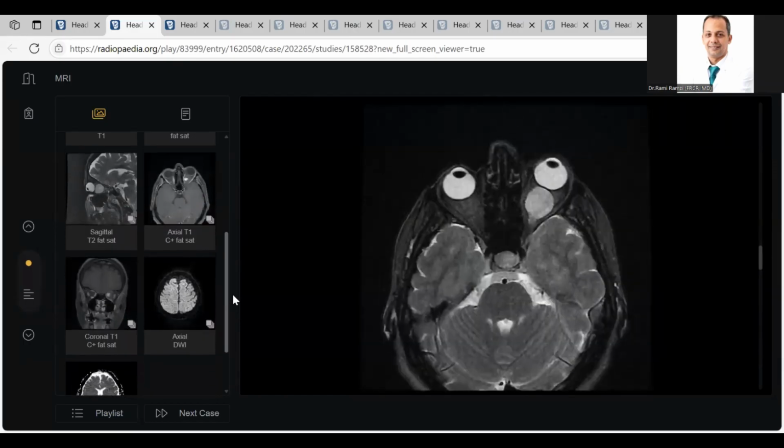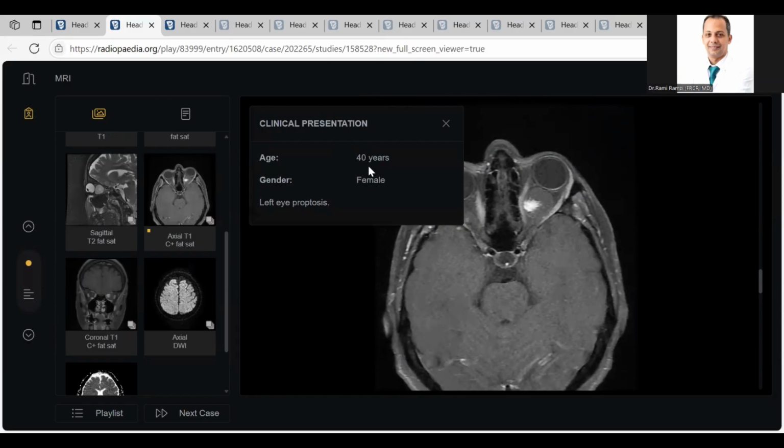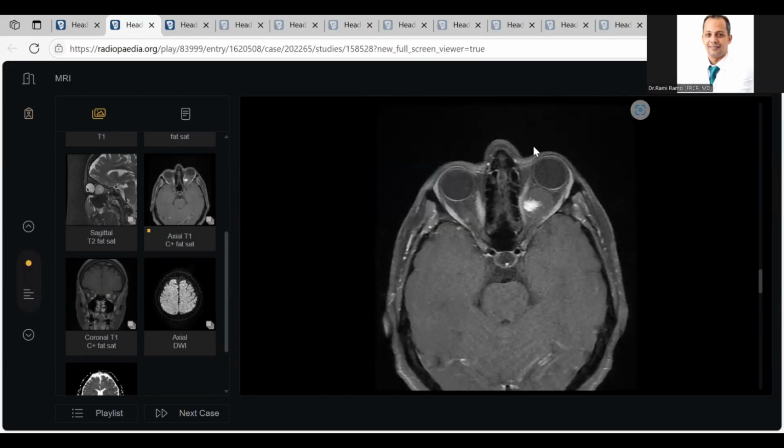Second point, it shows a cystic lesion with some mural enhancement. Revise again the age of the patient. Oh, it is not a young patient. But what is the commonest tumor? Benign angiomas. In young age, it is capillary. In elder age, it is cavernous. Like this, we can think during the exam.